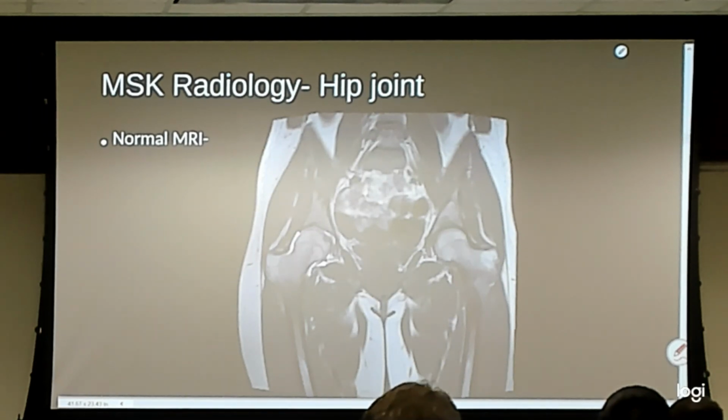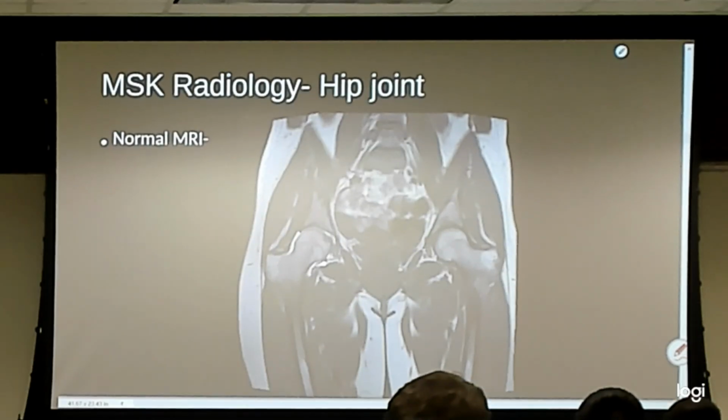You can also check the texture and the signal in each of the muscles, looking for maybe like that tendinitis we talked about yesterday, would be fluid signal within the tendons. Muscles, we could look for muscle tears, either complete or incomplete. So good soft tissue.